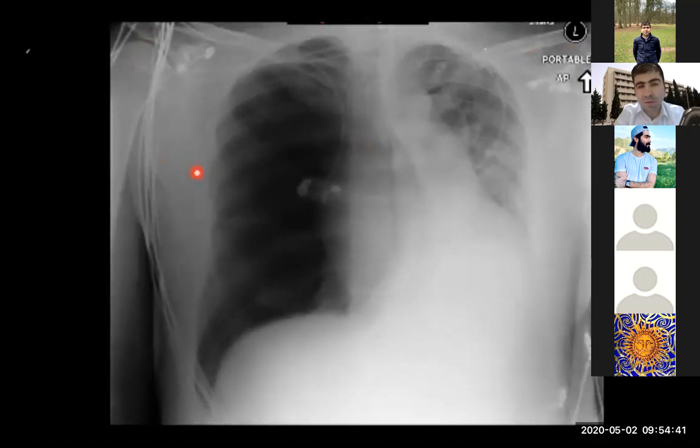So you picked up the pathology actually. There is a loss of lung marking here, so it is a darker color than usual. So this is a case of tension pneumothorax. Please don't miss such cases when you are in the emergency hospital in the next 2 years. This patient will come to you with shortness of breath and severe dyspnea. You send them for a chest X-ray. They bring you this chest X-ray, and you are the only doctor sitting there at that time, at midnight.